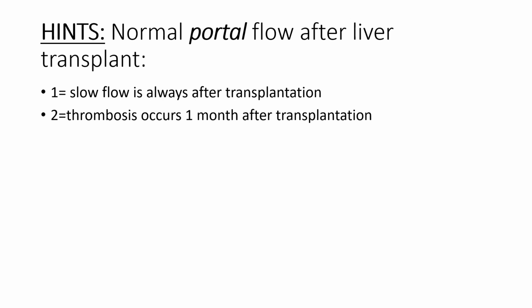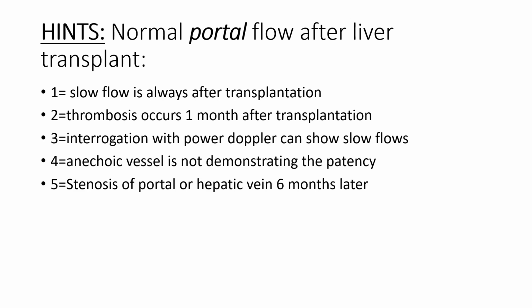After transplant, if we have normal portal flow, a slow flow is always after transplantation. In the first days it is normal, and thrombosis occurs 1 month after transplantation. Power Doppler is necessary, and stenosis occurs after 6 months.